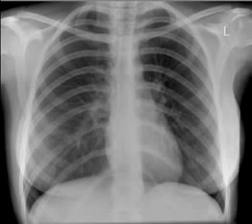A radiologist will also look for any avascular areas in the lungs to see pneumothorax, and will also look for any mass or consolidation. This is done by assessing symmetry of grayscales in both lungs, and of course subdiaphragmatic areas are also assessed. Vascular pattern is also assessed. Lower lobe vessels in an erect PA view should be bigger than upper lobe vessels. Otherwise, the patient may have cardiac problems.